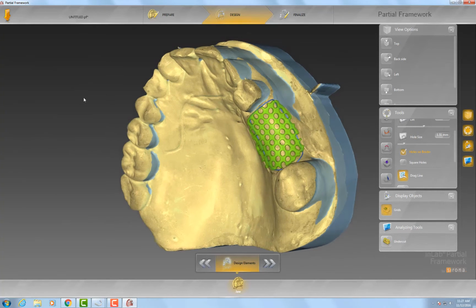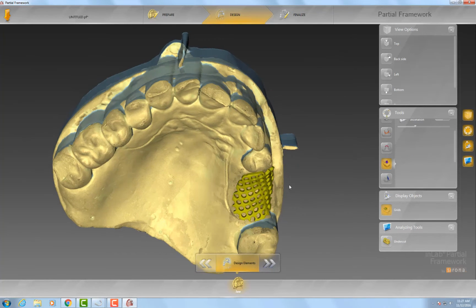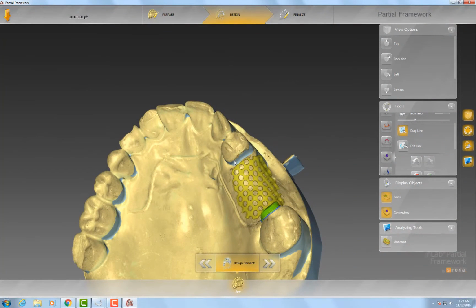So the next thing I really focus on is I'm going to have a connector, and that connector is going to go... I do want to make sure that they all intersect right about there. Okay, and then after that I can go to a rest.